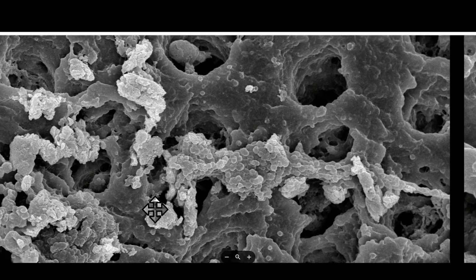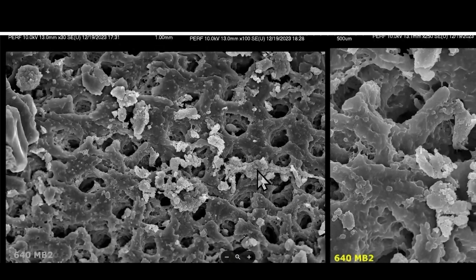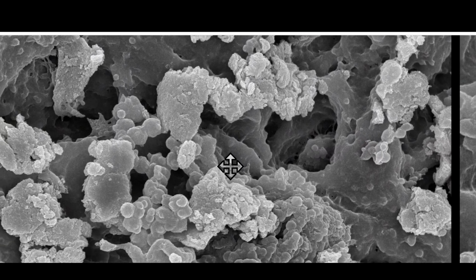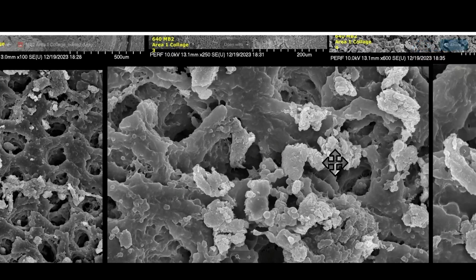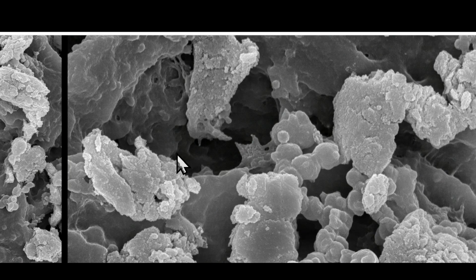And there you can see something that looks like a biofilm. That's just the demineralization of the pre-dentin. That's what demineralized pre-dentin looks like. It looks like organisms, but it isn't. And there you can see there's still proteoglycan still in the dentinal tubules that has not been removed by the bleach or the demineralization.